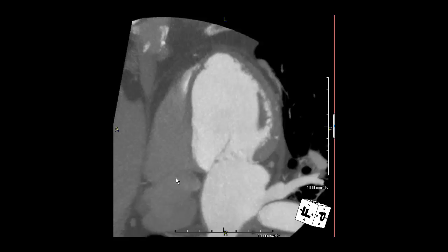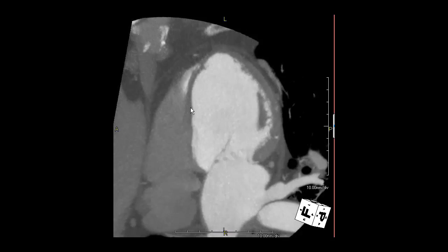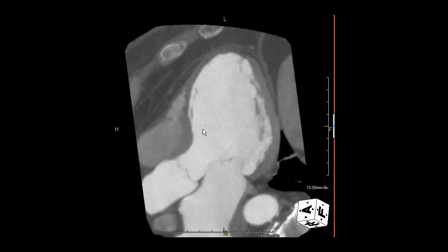We commence examining the overall left ventricular function. This is a horizontal long axis view. You can see here that there is clearly a severe hypokinesis to akinesis of the lower half of the interventricular septum, at least akinesis to possibly mild dyskinesis involving the apex, and preserved overall function of the lateral wall, specifically at the basilar section. This is the vertical long axis.